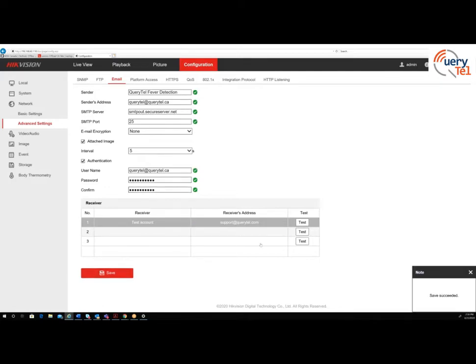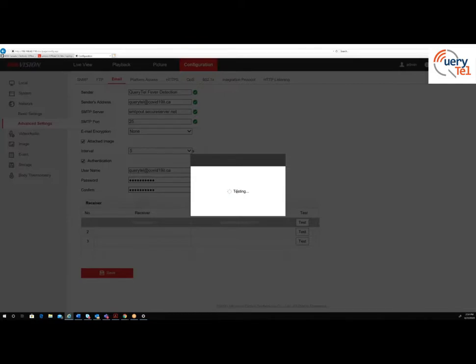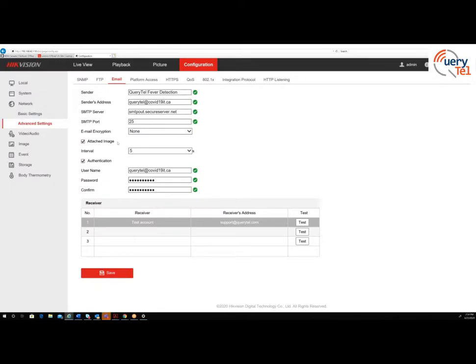Save. Test. Testing. Test succeeded. That's a good thing. So this is a simple account that I set up.